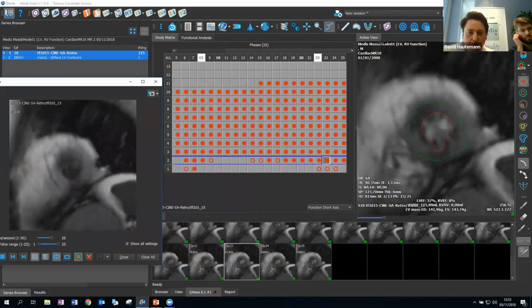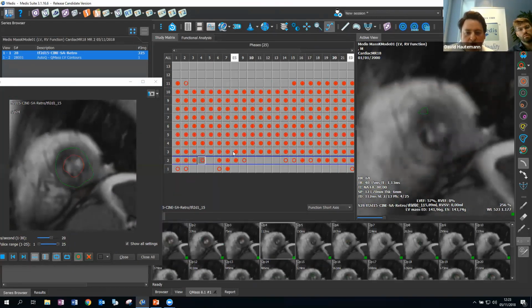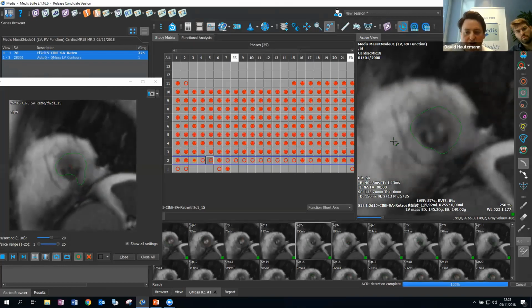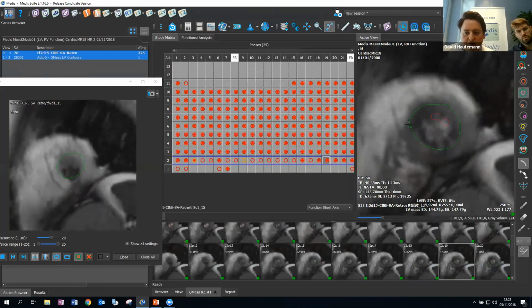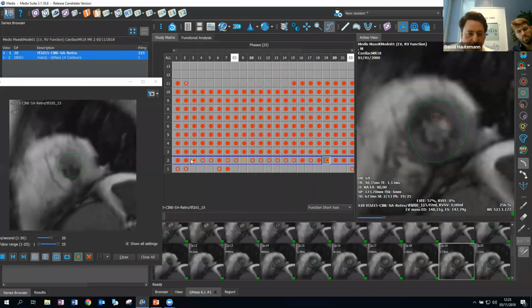This has already been in the software for quite some time. These blue buttons here, if you ever wondered what they're for, I'll show you. So for instance, there are a lot of outliers here. What I can do is turn this on, and then you get this clock. And then when you edit a contour, it will automatically propagate the contour to neighboring slices. And what you typically find is if you do 2 or maybe 3 edits, that the contours are pretty much in place. So I can edit a few contours, and it will semi-automatically edit neighboring slices.